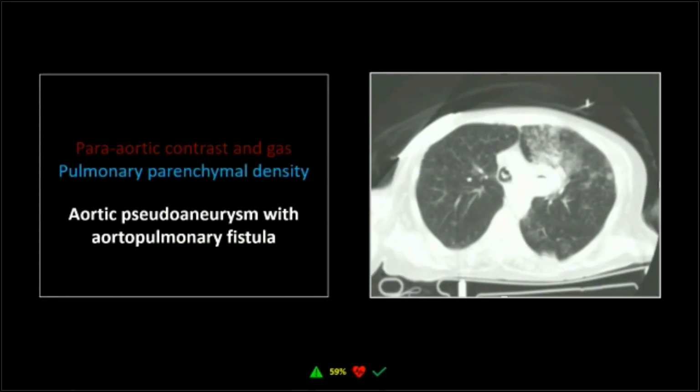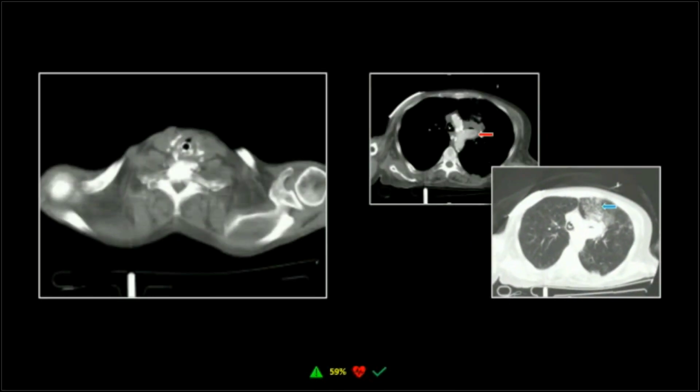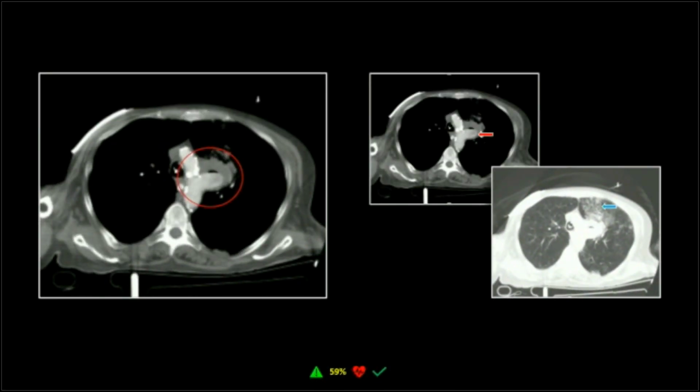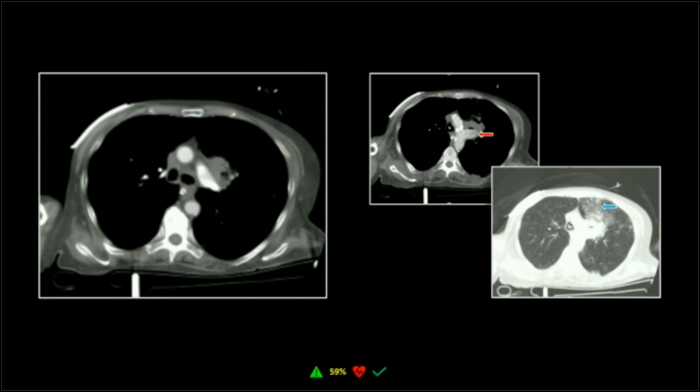You can see the vector. I like this because you can tell that's contusion from a blow to the anterior left chest. It's not distributed peripherally, concentrically around that pseudoaneurysm, which would suggest that it's actually aortic hemorrhage we're looking at. So I believe that's probably a pulmonary contusion that we're seeing because, again, it's directional. Again, that's just a very unusual place to get an aortic laceration.